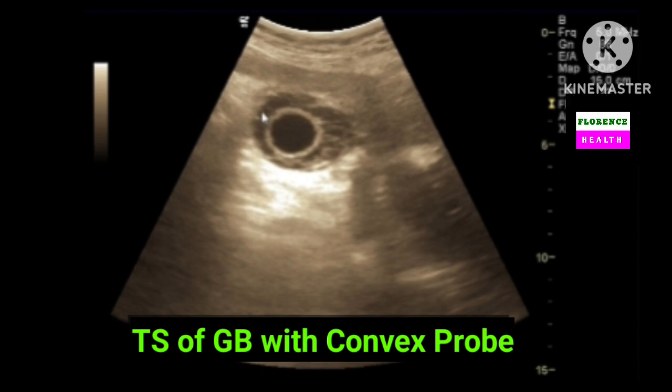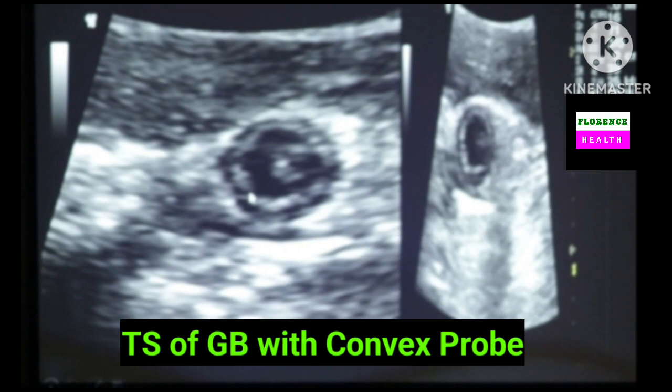This slide, a transverse section of the gallbladder with convex probe, shows the sandwich appearance of the gallbladder wall, which is in favor of acute cholecystitis, where three layers of the gallbladder wall are easily detected. The outer layer is hyperechoic, the middle layer is hypoechoic, and the innermost layer is hyperechoic. Again, a transverse section with convex probe shows three layers of the gallbladder wall, that is the sandwich appearance, which is in favor of acute cholecystitis.